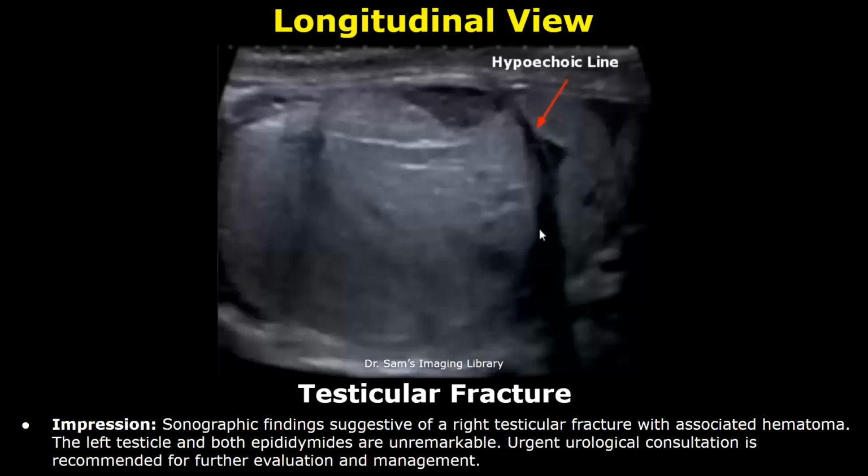This is the impression. Sonographic findings suggestive of a right testicular fracture with associated hematoma. Urgent urological consultation is recommended for further evaluation and management.